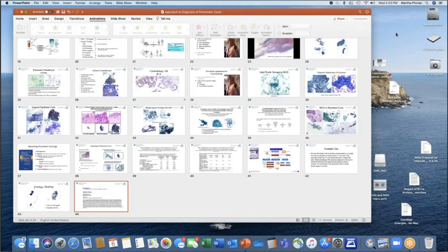Now, the tricky part comes when you have transgastric FNAs, where the lining of the stomach is gastric foveolar epithelium. And it can be impossible to distinguish gastric foveolar epithelium of the stomach from gastric foveolar epithelium of a branch duct IPMN. So that's why I was saying you had to be sure if it's lesional gastric foveolar epithelium or not.